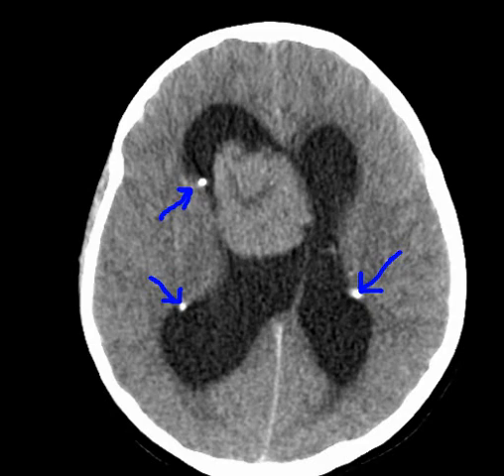And even in real life scenarios, please look closely at the level of the foramen of Munro and perform post contrast images to diagnose an associated subependymal giant cell astrocytoma.